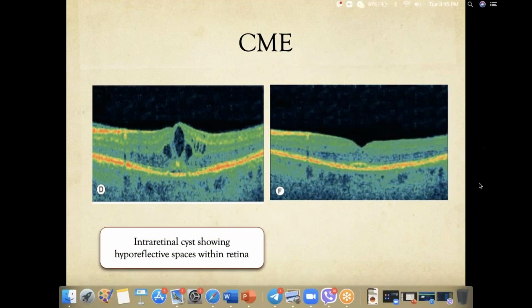All right. So after the injection, what happened? This was the outcome. So what would you say now? What do you all think about the outcome? Do you still agree that the patient will have a poor central vision?